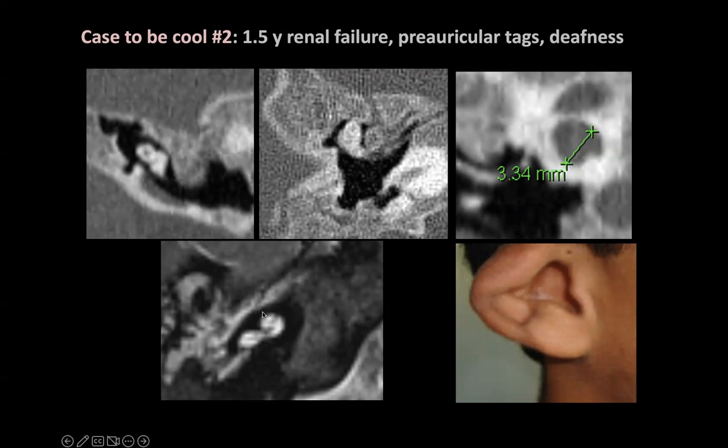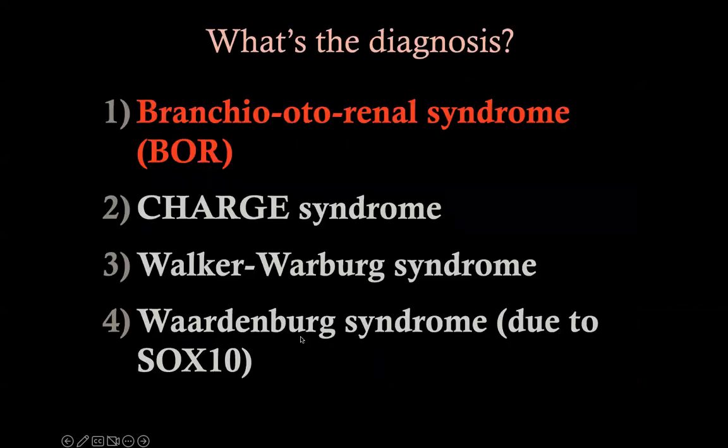because it looks like that, it didn't get to turn on itself. And when you see something like that, in association with this ear, keep looking and maybe look at the kidney. The kidney may also be abnormal. So you have kidney and this unwound or anterior offset cochlea. Look at this again, pattern recognition. This is typical of branchio-otorenal syndrome.